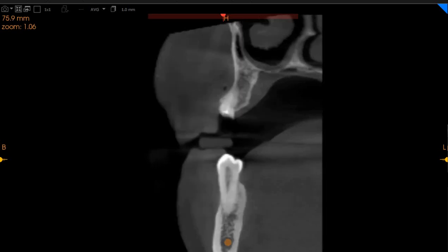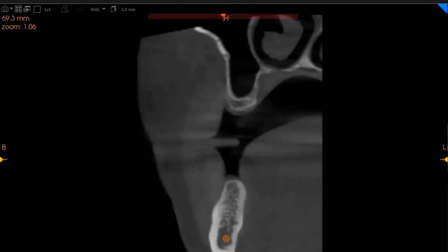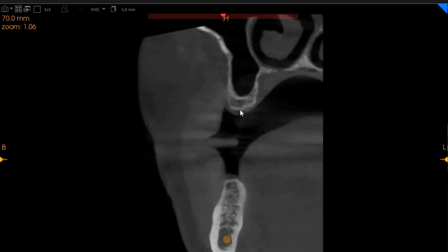When we move on to the region of the 6, this is where we've got very limited bone structure. So a lateral window sinus lift is definitely advisable. If we can show you, we've got 4 mm of bone height with approximately 7 millimeters of bone width. So you will need another 4 millimeters of expansion into the sinus, and hence we would highly recommend that a sinus lift from a lateral window approach should be done here.